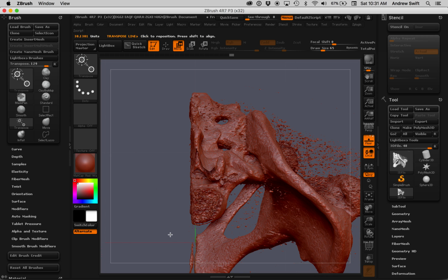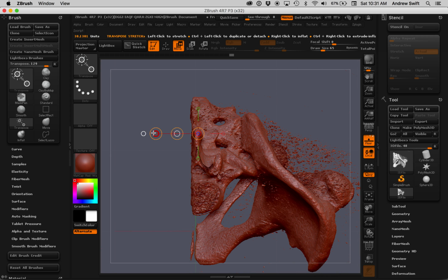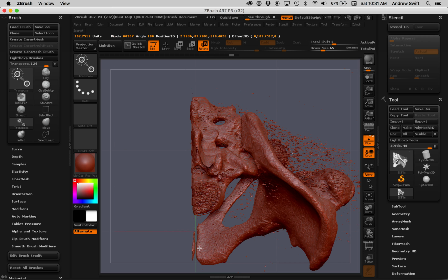And now we need to move the pubic symphysis back off a little bit. So I'm just going to, notice I clicked outside the red. I clicked on the golden circle there, and I'm holding down Shift to lock it into place. And I have the Move tool active. That's not what I want. Click on Rotate. That looks about right. Yeah. All right. We're not building a piano. All right. So that's how you get symmetry in that object.